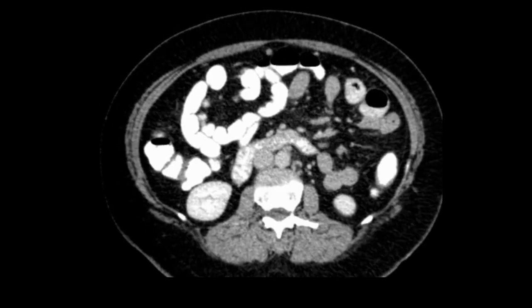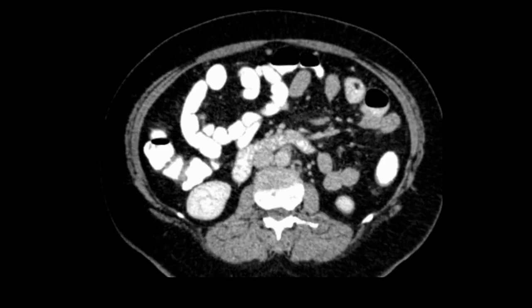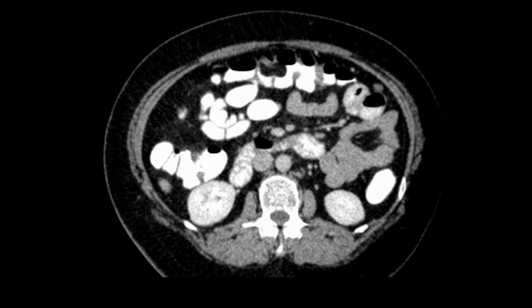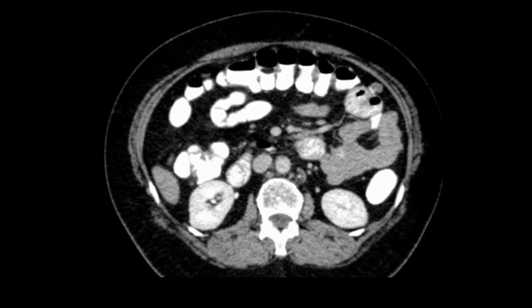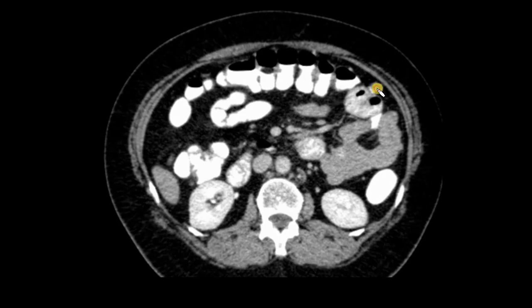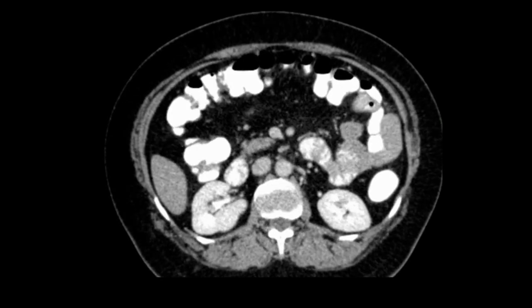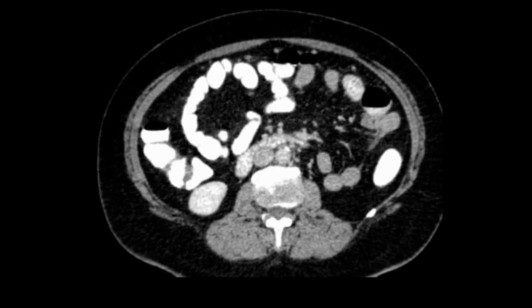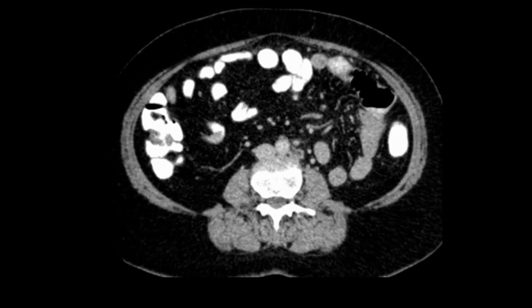Now there are other interesting findings in this case, like this lesion. Okay, now I'll remove the dot and trace it for you. Right, there is a lesion in that area. There is a big lesion in this area. So this patient had some small metastatic GIST as well. Okay, if you see this one, remove the marking, metastatic GIST. Right, so diagnosis came as metastatic GIST. So this is the importance of viewing the scan on the consoles.